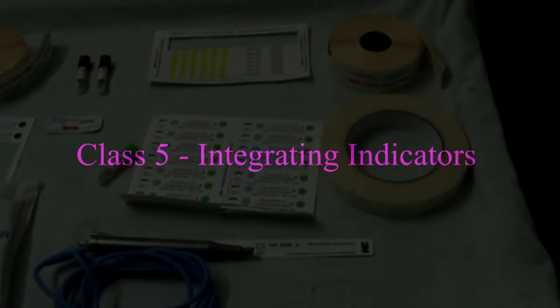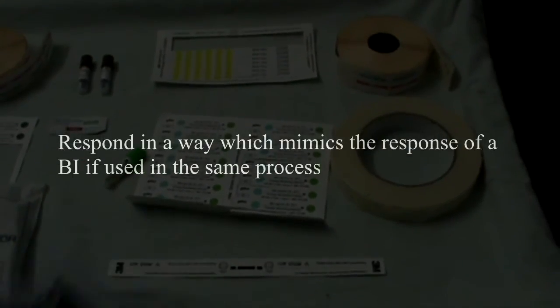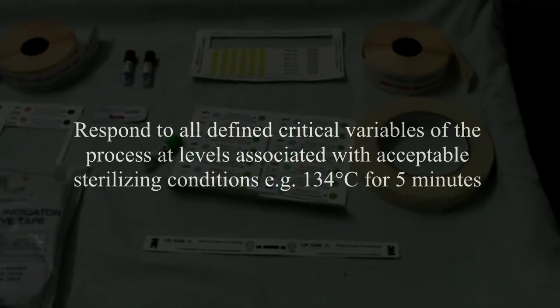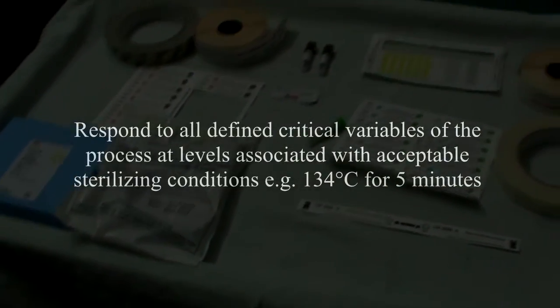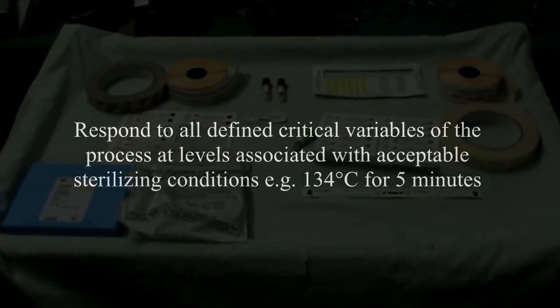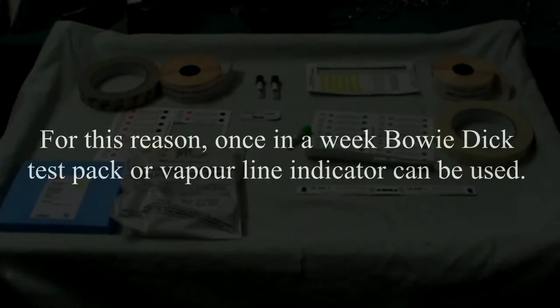Class 5. Integrating indicators. Respond in a way which mimics the response of a BI if used in the same process. Class 6. Emulating indicators. Respond to all defined critical variables of the process at levels associated with acceptable sterilizing conditions, for example 134 degrees Celsius for 5 minutes. For this reason, once in a week a Bowie-Dick test pack or vapor line indicator can be used.